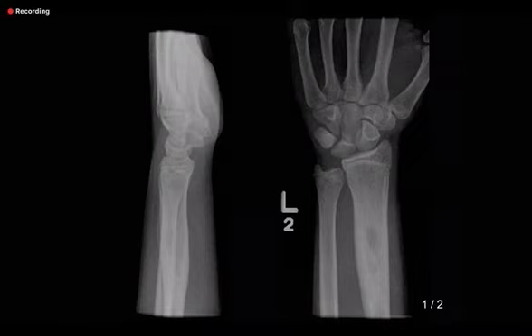So in this case, the feedback would be that osteomyelitis was fine, Ewing's was fine, and you can say that I did consider osteosarcoma. However, because it is more diaphyseal, more central, and not eccentric, and there is no osseous matrix, that is less likely. This thinking process is what they are particularly interested in.